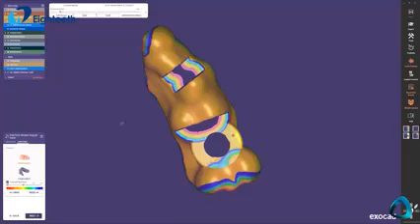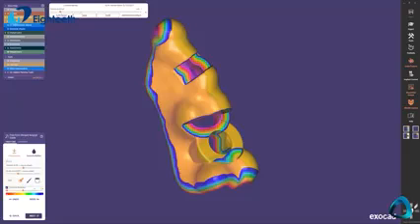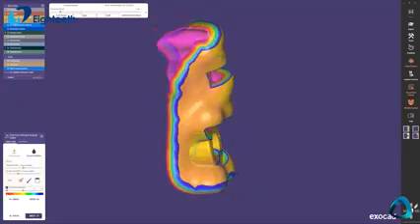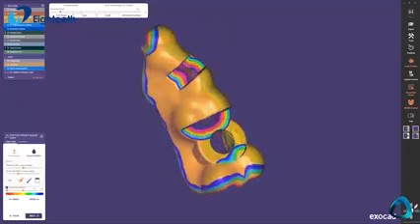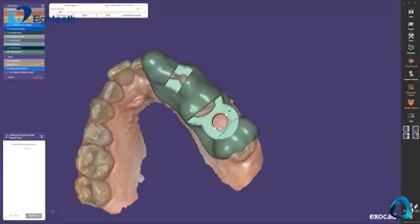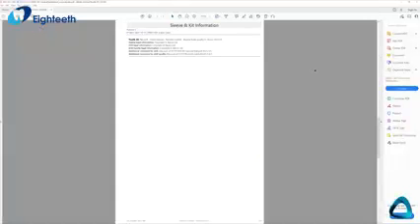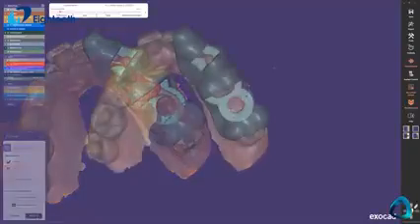The final step is then merging the surgical guide. What this means is you will now merge all the different parts of the guide that you have designed into one single unit. You can then make any final adjustments by using the free-forming tools to add, remove, or smooth material on this final surgical guide. And that's it. Your surgical guide is now ready, and using Exocad you can quickly generate the surgical guide files, and these can then be sent to your 3D printer to be fabricated in-house.